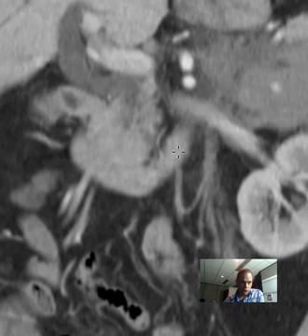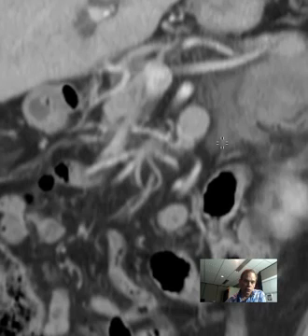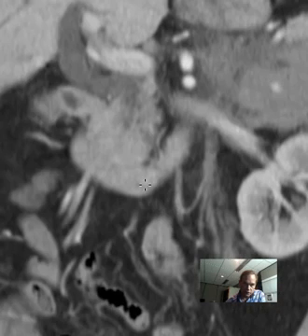fourth portion, you remember, is just a little upward turn like that, beyond which it gets out of the retroperitoneal compartment and moves into the mesentery right here. So it's no longer retroperitoneal. Here it's retroperitoneal. That's why it's fixed like that.